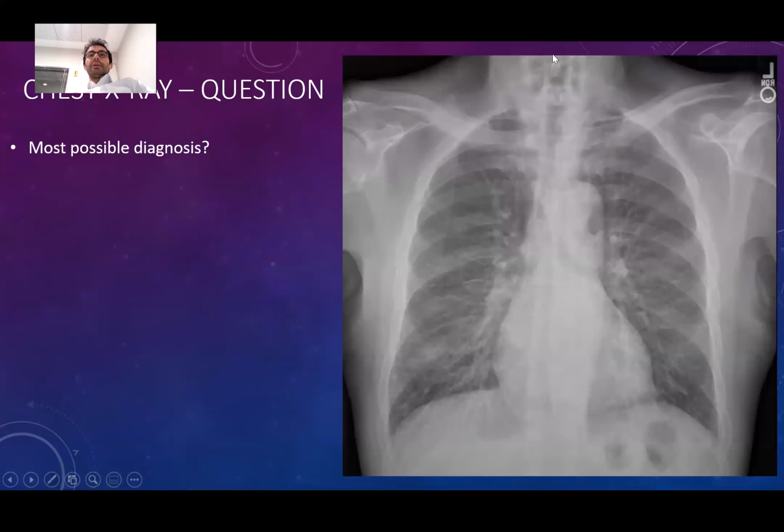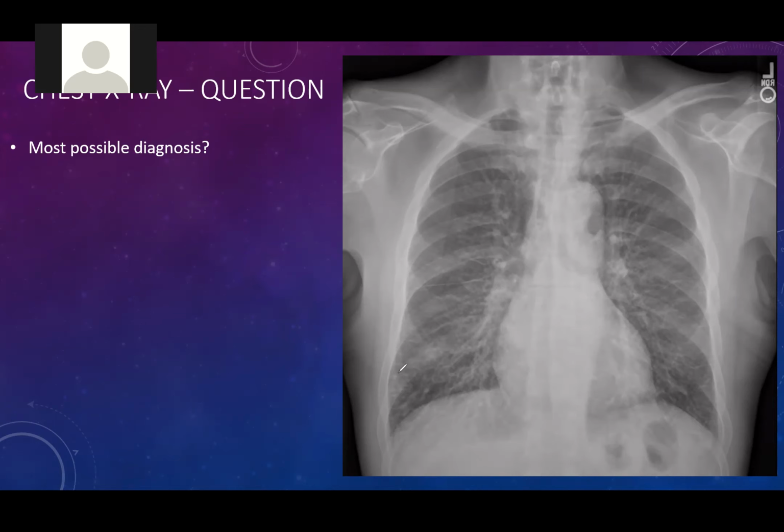Moving up further, I can have volunteers. What is the possible diagnosis in this patient, people? Heart failure, I think. Heart failure, you think. But why? Looks like increased interstitial edema around the heart. Interstitial edema, right? We are seeing Kerley B lines.